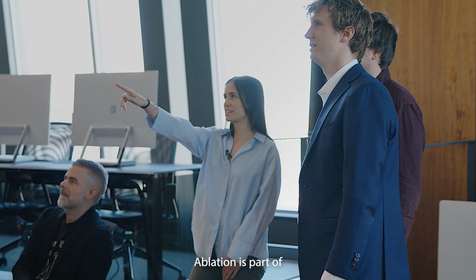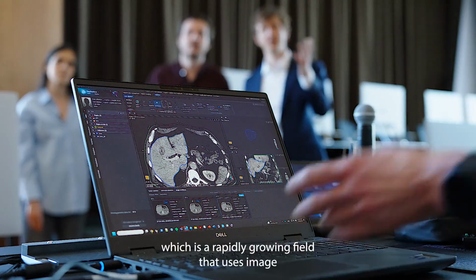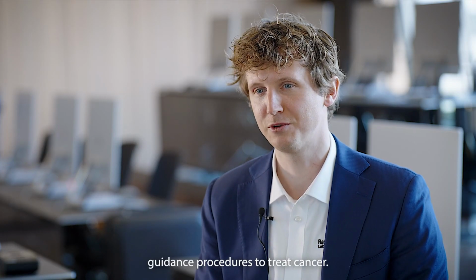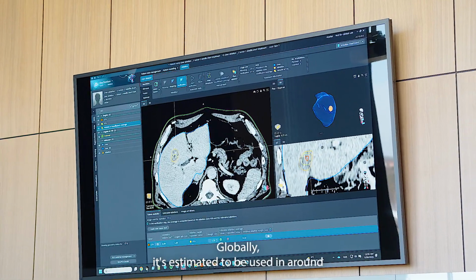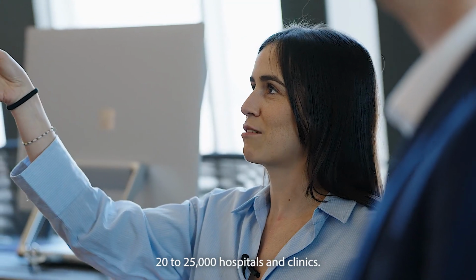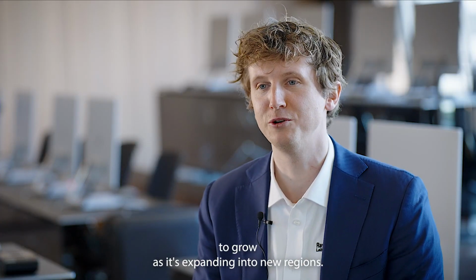Ablation is part of interventional radiology or interventional oncology, which is a rapidly growing field that uses image guidance procedures to treat cancer. Globally, it's estimated to be used in around 20 to 25,000 hospitals and clinics, and this number is only expected to grow as it's expanding into new regions.